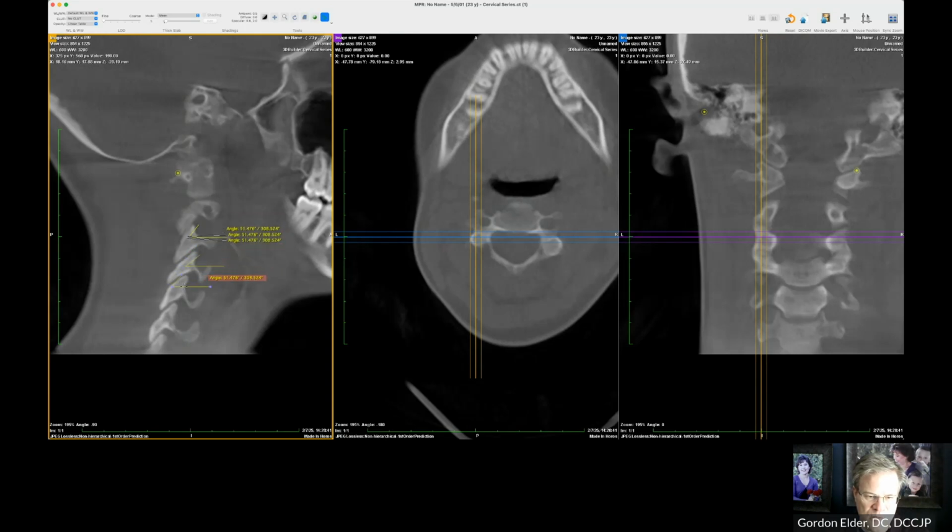And notice that I'm always moving things away. The other thing is I'm always measuring the lower joint. So as a standard, Dr. Blair determined that C2 misaligns in relation to C3, not C3 into C2. Now I have found sometimes, because of maybe the direction of the original injury was low going up and vice versa, that sometimes I want to adjust C3 in relationship to C2, but it's not something we teach.